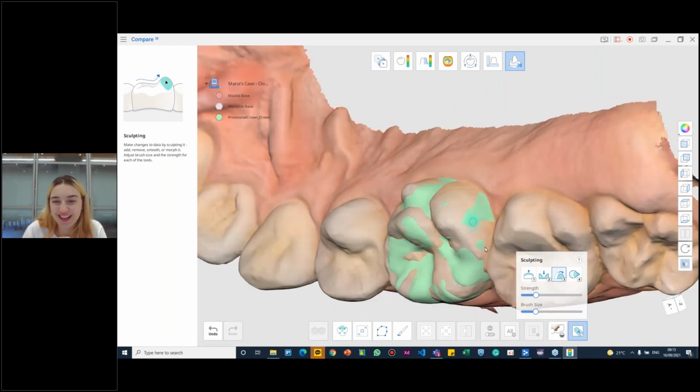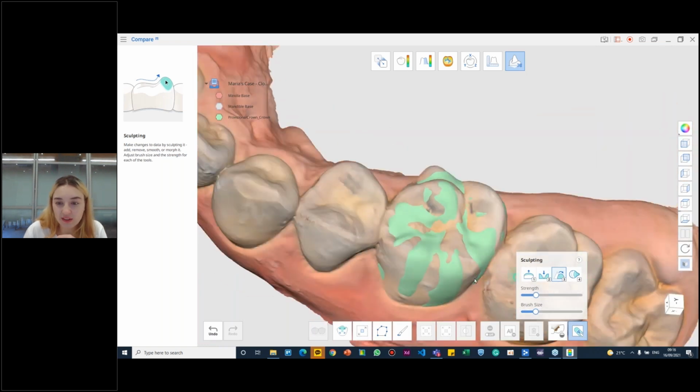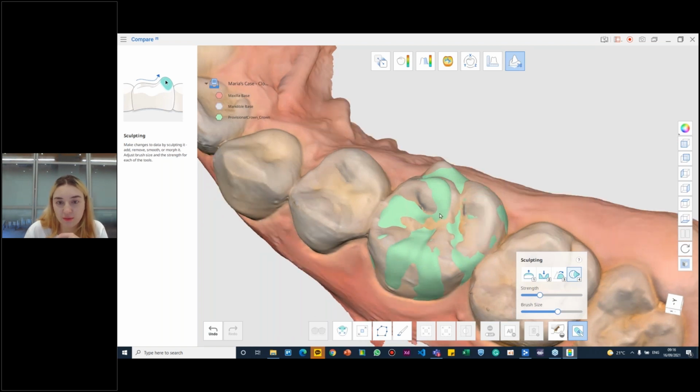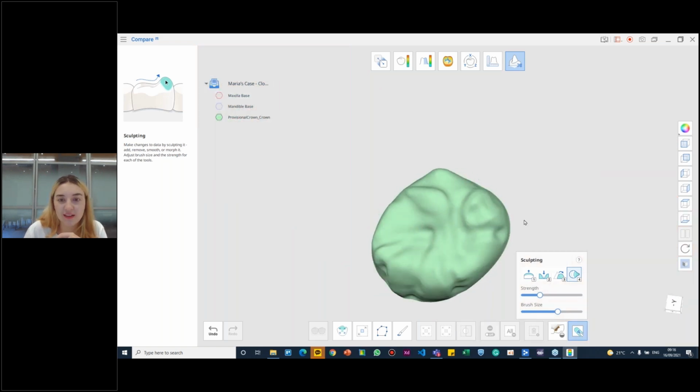Thank you. So yeah, I think now that it's good, I can actually morph data, so I can change the parts. I can change the anatomy of the tooth a little bit. So all in good fun. Let's see.